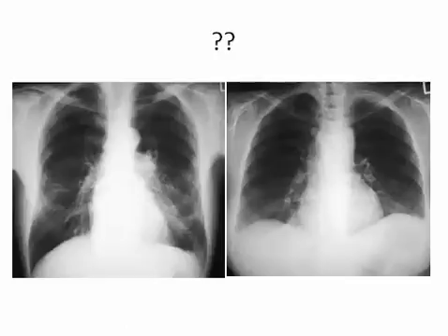So what is this? This is asymmetry of the hilum. There is dense hilum. This is a central type of bronchogenic carcinoma, which is the aggressive type, the oat cell type, and usually this leads to death within 3 to 6 months. Now this one is the left Pancoast tumor with the opacity at the left superior sulcus here.